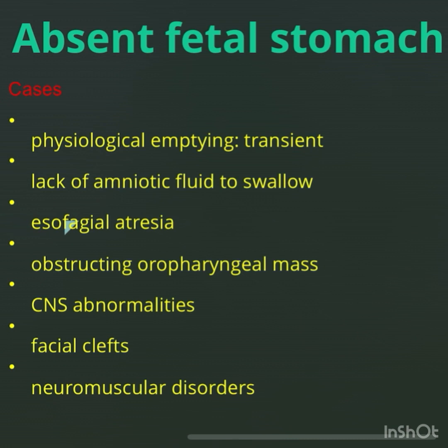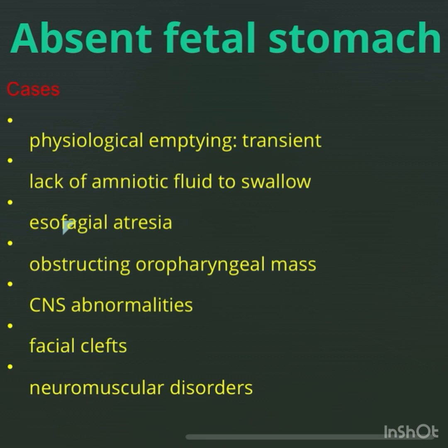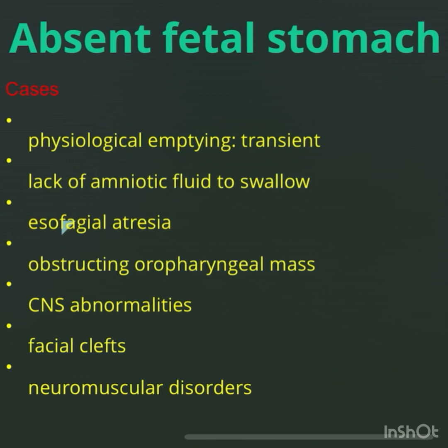Always keep in mind that non-visualization of the fetal stomach may be physiologic and transient. So we should wait and examine the fetus for at least 20 minutes, as the stomach may be contracted and could not be visualized. The most important and most common cause of absent fetal stomach is esophageal atresia.